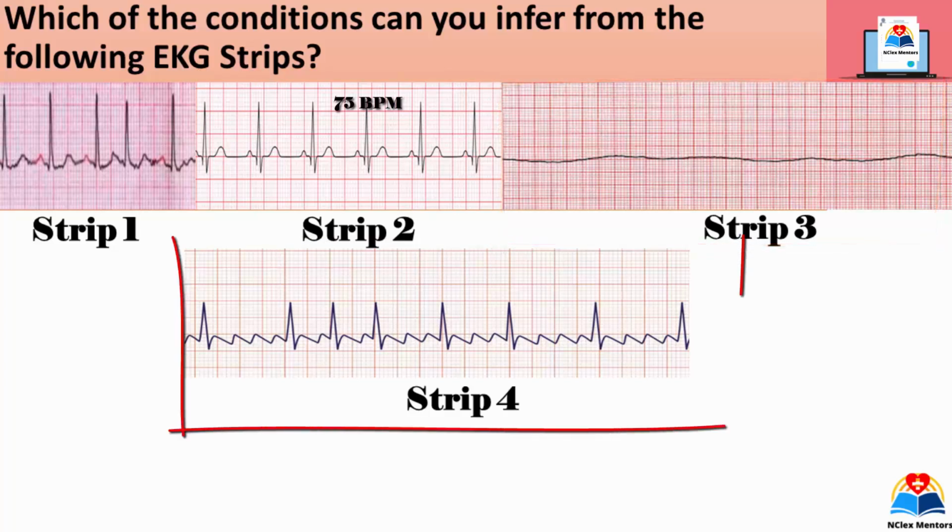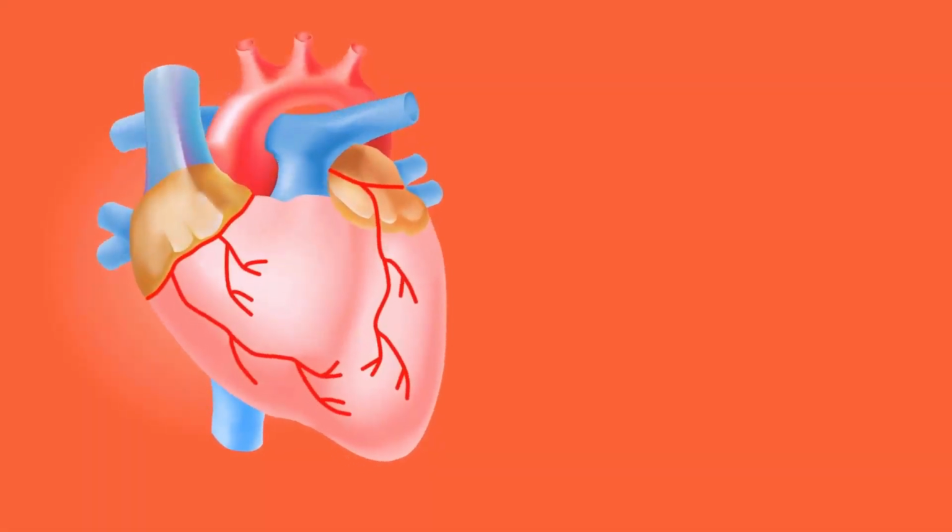This is atrial flutter. As we discussed, this can be identified with identifiers such as extremely high heart rate. The rate is regular. The P waves are well defined and show a sawtooth pattern. Well, we have discussed a lot of things with these diagrams. You are doing a great job and good progress. Keep it up.